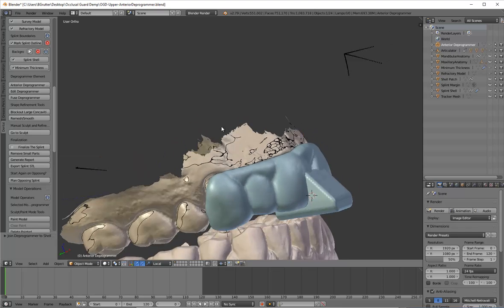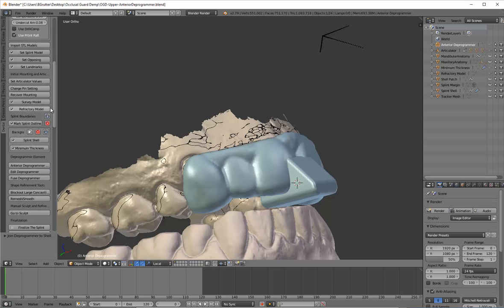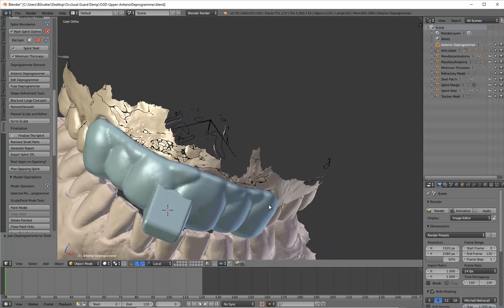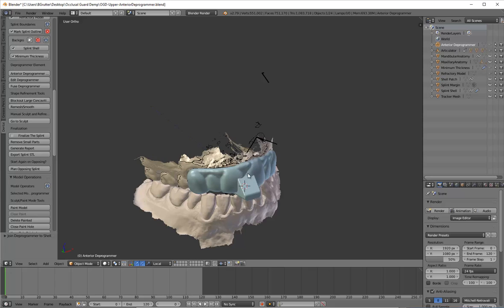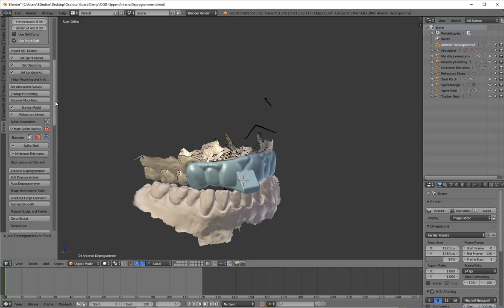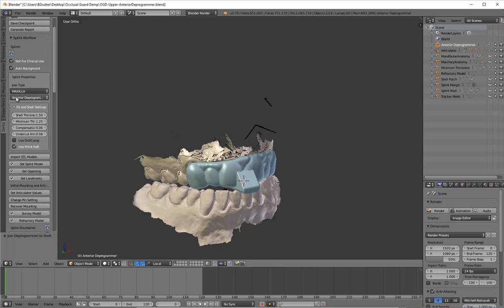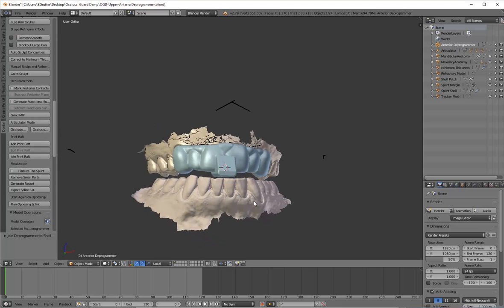One thing that is a little bit peculiar on this is that even though I checked that box up top to use print raft, it's not visible. I've designed my entire splint. The only thing I haven't done is subtracted the inside, which we know is that button, finalize splint. But before I hit that, I want to add my raft. So a little bit of a glitch here in the system so far is that we need to change it from a deprogrammer to flat plane or a Michigan, one of these two. You're not going to change anything with the design. It's not going to affect anything. But now the add print raft is visible again.